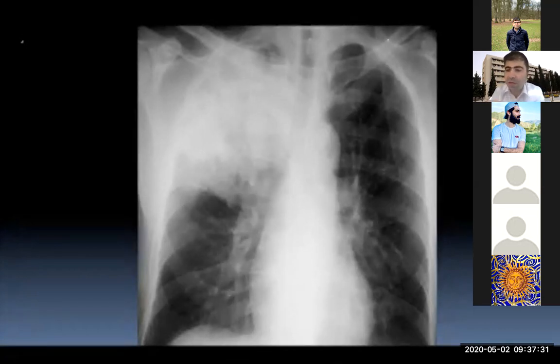And if you see here, this is a transverse fissure, which is partly up, or S shaped. And this is consolidation, most likely seen with CA bronchus, a large one occupying this area. And if you concentrate, there is some erosion of ribs.